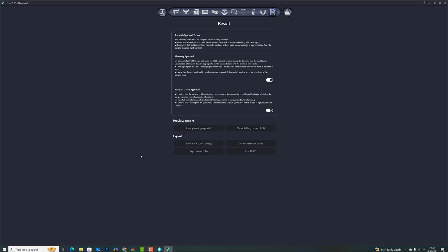So that's an overview of the Tru Abutment Pylon software. Hope you liked it, and hopefully you will play with it. Thank you very much, and goodbye.